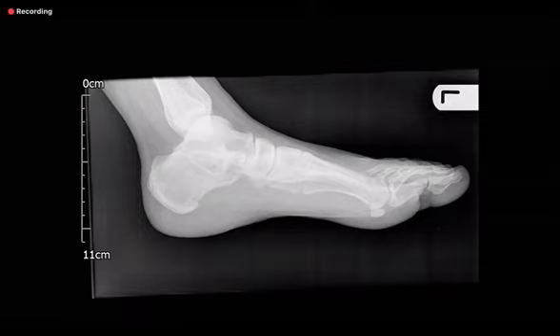So what is happening here? Sorry, I can't see the cursor. So leave it for me. What is happening here? Excuse me. Can you hear me? Yes, I can, but I can't see the cursor. You don't touch the mouse. I am taking control and I'm asking you a question. Okay. What is happening here? Can you see my mouse? No, sorry, I can't see it.